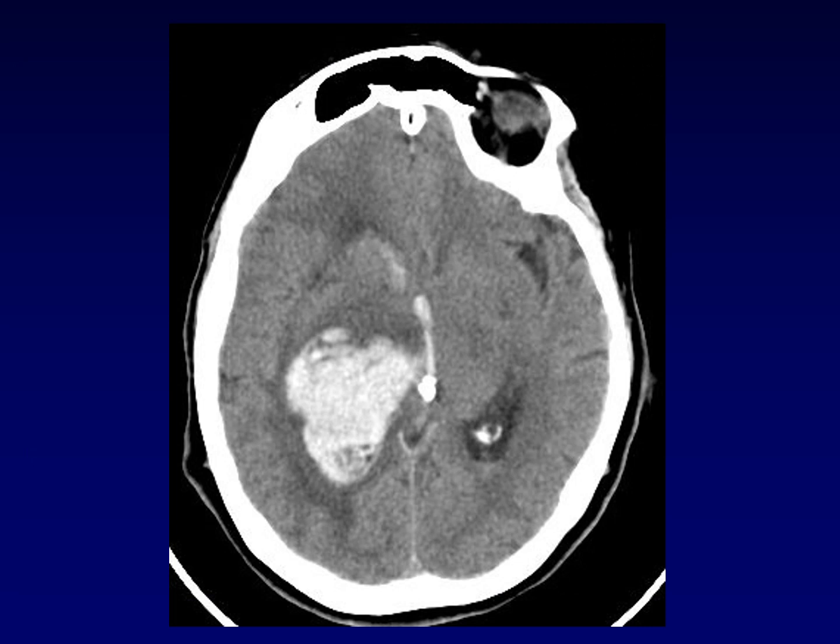The last compartment that we're going to be in is parenchymal hemorrhage. Here you can see that this hematoma is completely surrounded by brain on all sides. That's what lets us know that it is in the parenchyma itself. It is below the pia mater. It is an intraparenchymal hemorrhage.